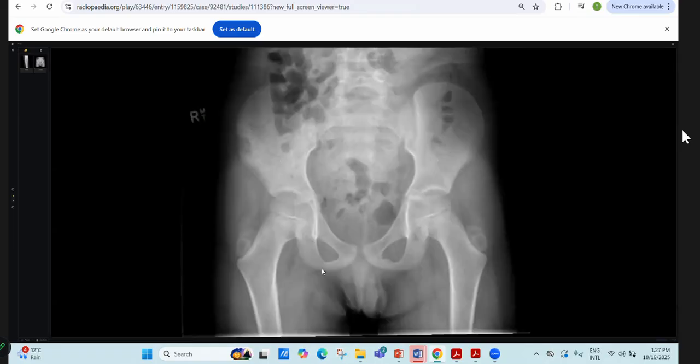In the X-ray pelvis, there is slight sclerosis over the neck of the femur and the proximal metaphysis of the femur. In a young skeleton, this can be some osteoid osteoma. I would like to ask if there is history of night pains. If it is a runner, this can be some stress reaction, or if there is any history of fever. You want to review the film again.